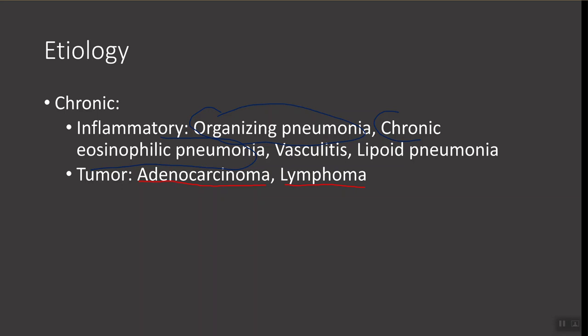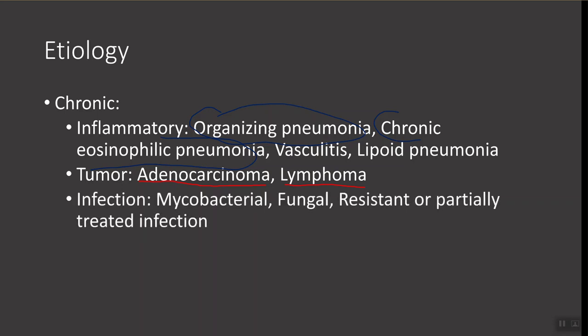And this is one of the main reasons why we recommend follow-ups for people that have consolidations on either chest x-ray or CT to make sure that they resolve. If they don't resolve, one of the things that you have to always consider is that you're looking at an unusual pattern of tumor caused by adenocarcinoma or lymphoma.